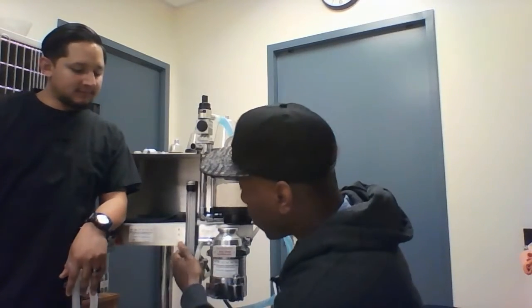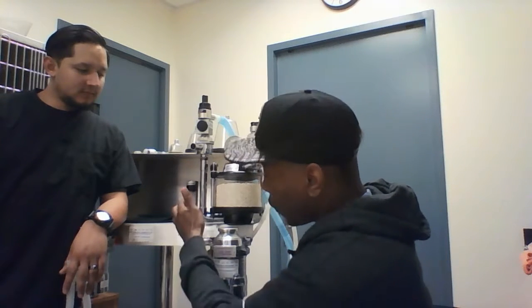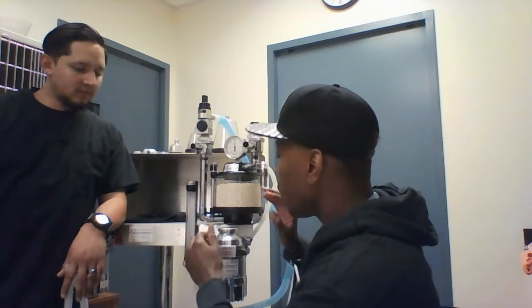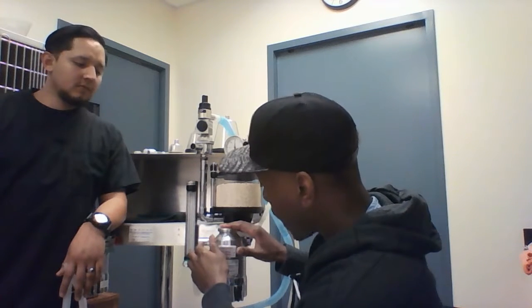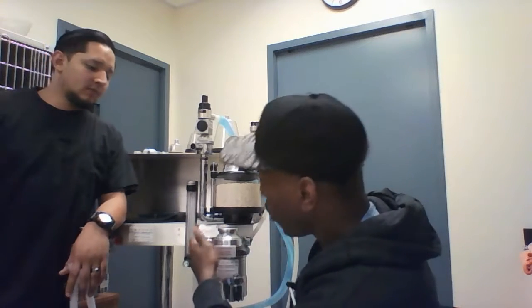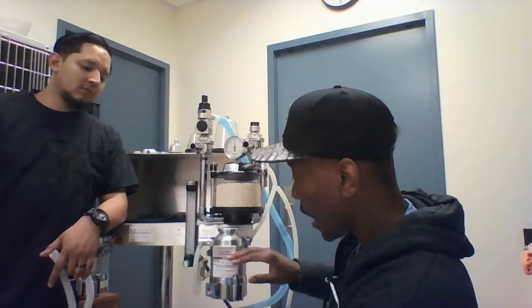Today we're going to talk about the anesthesia machine. First we have the flow meter, which measures your oxygen in liters per minute. Your oxygen travels through your flow meter, through your vaporizer inlet valve. The vaporizer itself has a dial which indicates how much isoflurane you're administering to your patient, along with the safety latch here which prevents all personnel from being exposed to any isoflurane.